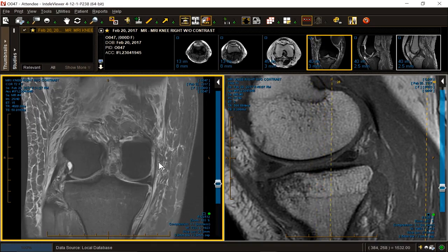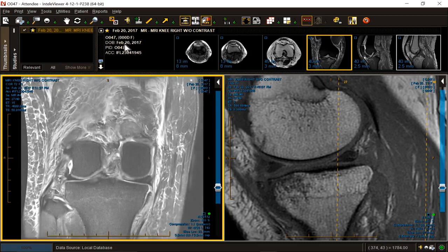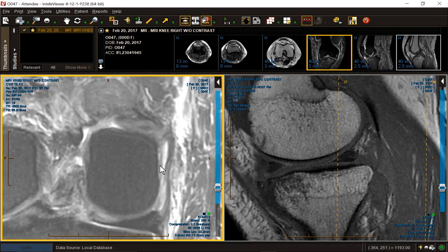So when you're in the back, really these are superficial fibers of the MCL, and this is the POL right underneath it. I'll blow it up a little bigger so you can see it. It's hard to see. It's right there. That's the POL. The POL has 3 slips, a superior slip, a central tibial arm, and a distal arm, and these are really hard to sort out. The POL is also known as the ligament of Winslow, not to be confused with the transverse anterior ligament of Winslow that connects the 2 anterior menisci.